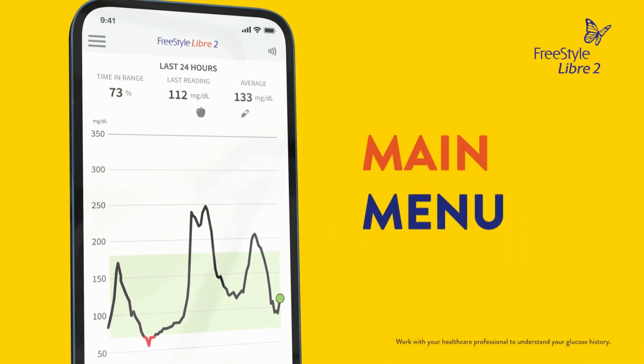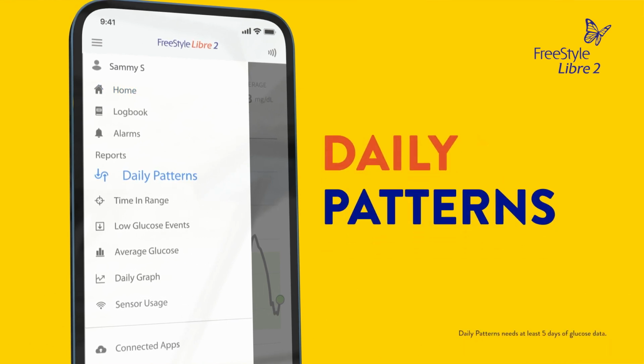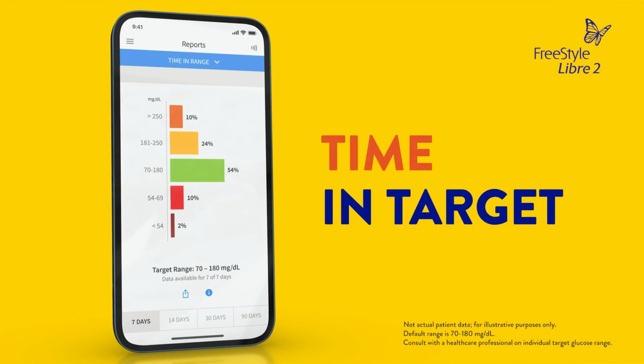Tap the menu icon in the top left corner of the home screen to view a list of available reports. Daily Patterns is the first report. It shows you how your glucose levels change during a typical day. It can help you and your healthcare professional identify times during the day when you might need to change how you're managing your diabetes. The Time in Target report shows the percentage of time you spent within, above, and below your target glucose range.